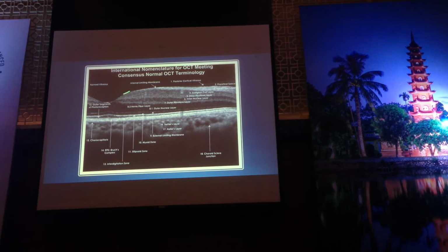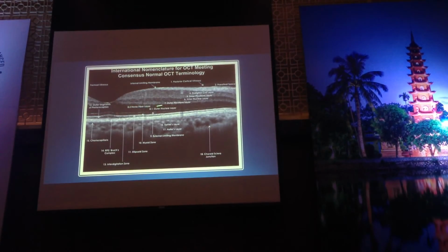In this image, the vitreous is black, right? But the tissue that has higher reflectivity is white, and some tissue is more white than the other. This band here is highly reflective, and this band here is weaker. It's what we call weakly reflective, right? So this fiber layer here, number 3, the nerve fiber layer, is highly reflective. But the cellular layer is not as highly reflective.